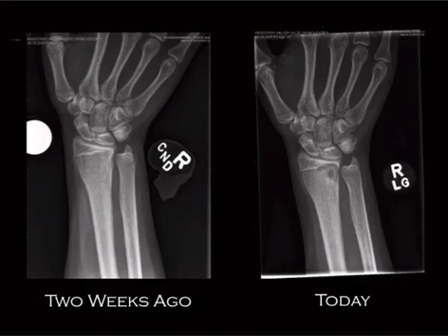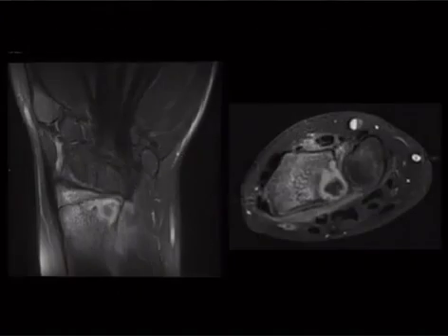Unlike a fat old diabetic that gets osteomyelitis from stepping on stuff or having an ulcer, kids tend to get hematogenous spread. And this is where it ends up, right at the metaphysis. So if you got an MR, post-contrast, see something like that, looks just like an abscess, right? Notice that it's sort of blocked off by that physis.